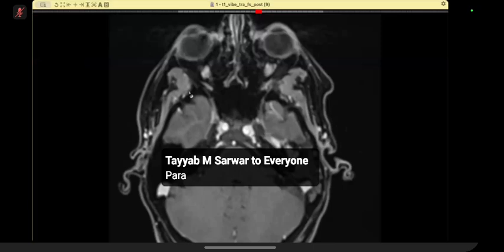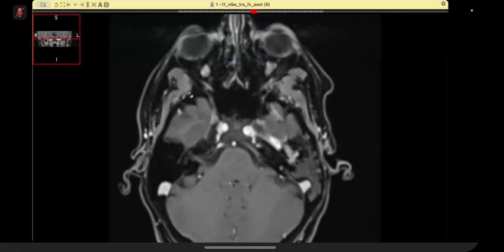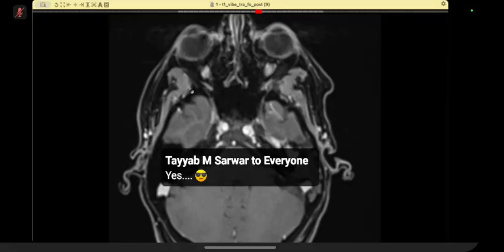Madam, schwannomas do not behave like this, right? Schwannomas are very well defined. By the way, there is a concept of facial nerve schwannoma, which can be in the canal. They are very small and things like that. This mass is completely filling up the middle ear cavity and it is enhancing profusely. So, what comes to your mind? Meningioma. Okay, middle ear meningioma. Yeah. Okay.